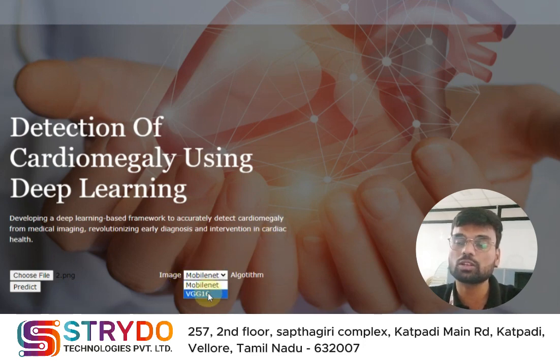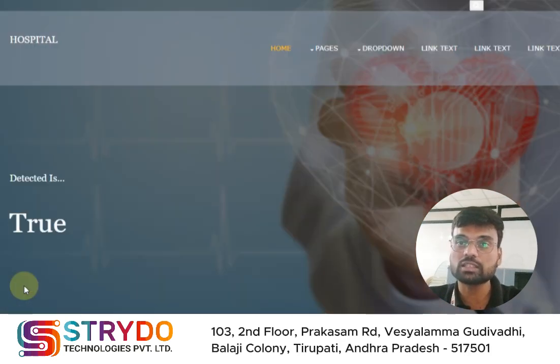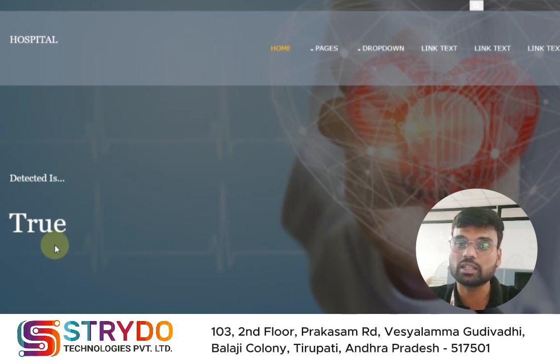Here I gave two algorithm options, VGG16 and MobileNet. In VGG16 I got 73% accuracy, and in MobileNet I got 72% accuracy. So I go with the VGG16 algorithm. After selecting the algorithm, I click on the predict button. After clicking, it says true. That means cardiomegaly is there, and that the person has some cardiac issue.